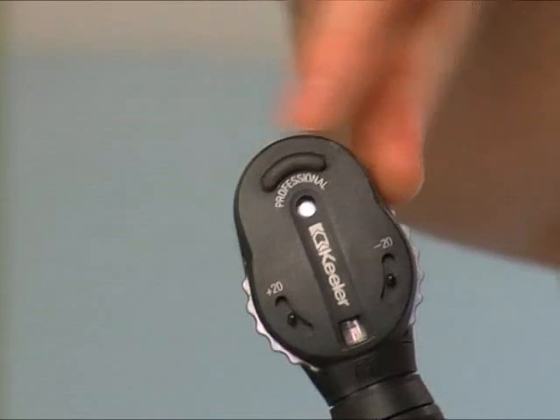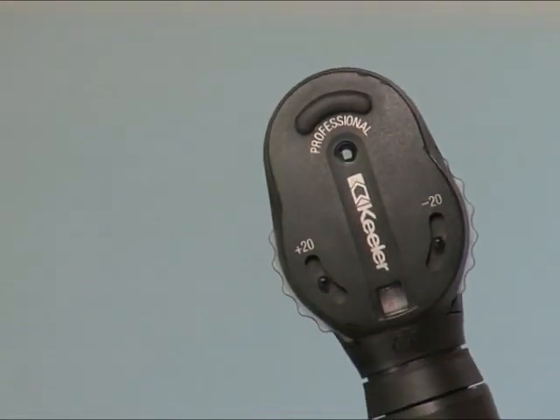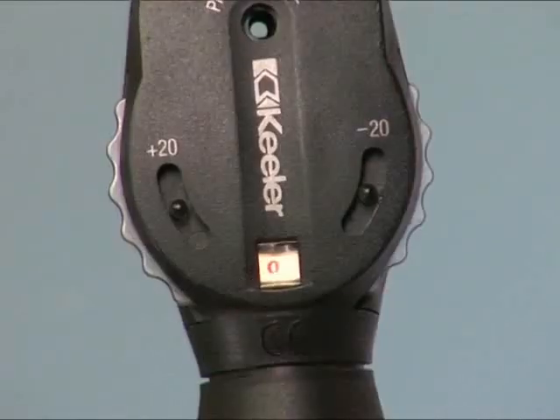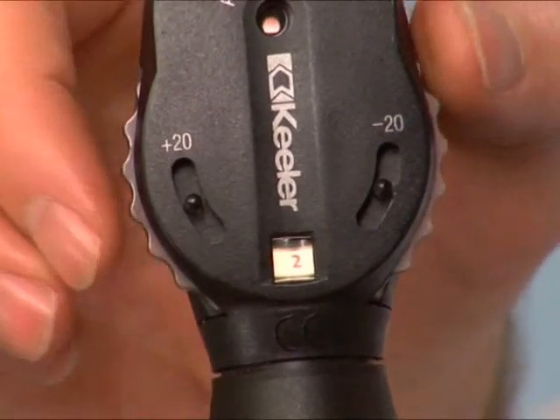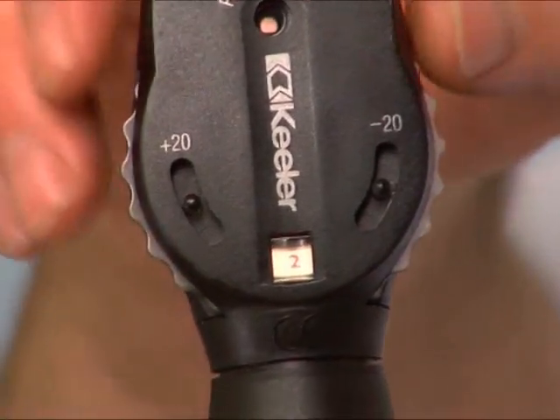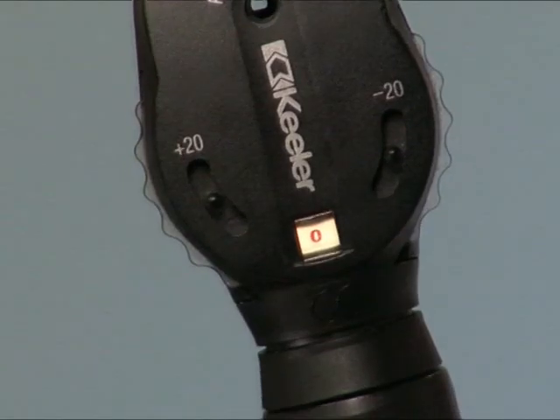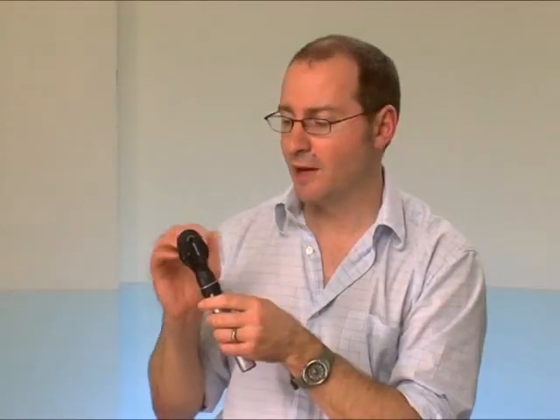All ophthalmoscopes have a little rubber stopper here, which is to go close to your eyebrow. So if you do wear glasses, you need to use the ophthalmoscope without the glasses on and have the ophthalmoscope close to your eye. In addition, you've got a lens carousel which changes the lens that you're looking through. To work out the lens setting that is best suited for you, the easiest way of doing that is to hold the ophthalmoscope close to your eye and then find a line or an area of contrast on a wall and rotate the lens barrel until you get that line in sharp focus, and that will be the setting for you to examine the fundus.